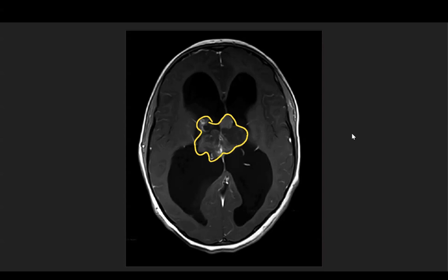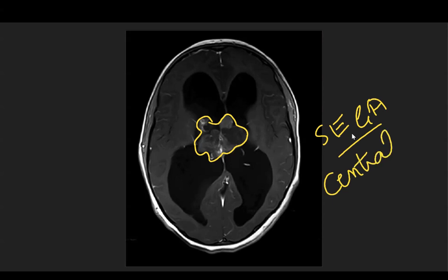Exactly. What about SEGA? Would you keep it in your differentials here? SEGA would be avidly contrast enhancing, if I'm not mistaken, which this is not. There is enhancement, but it's not avid enhancement. What about central neurocytoma?